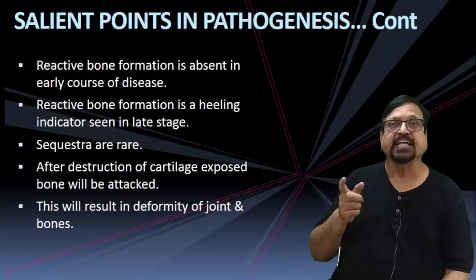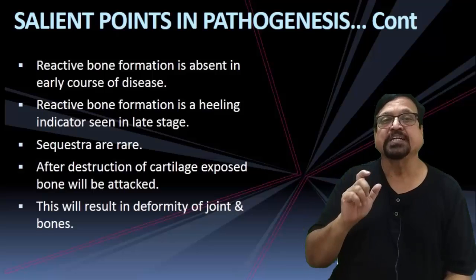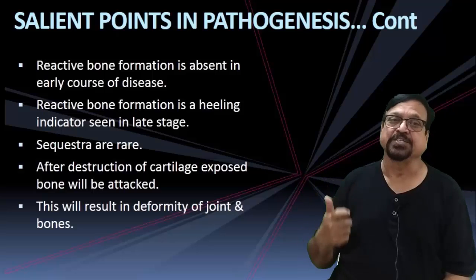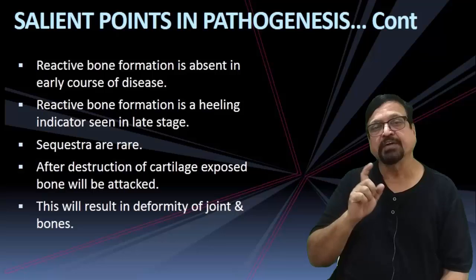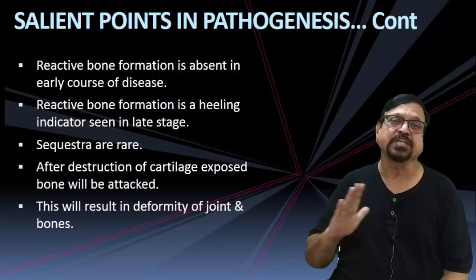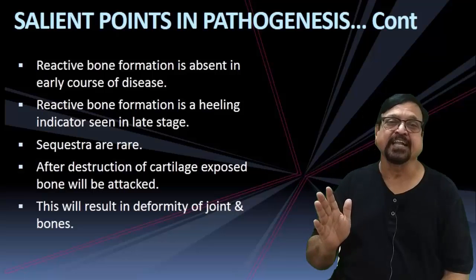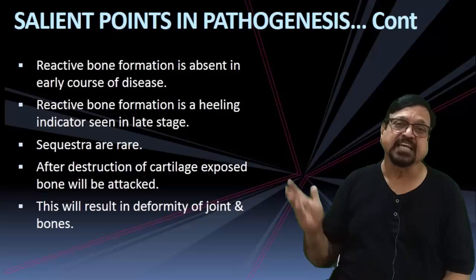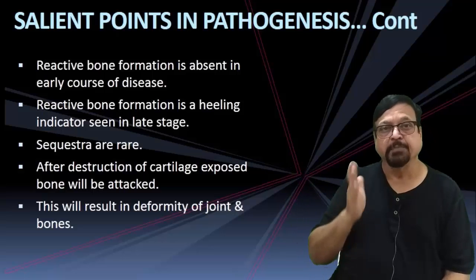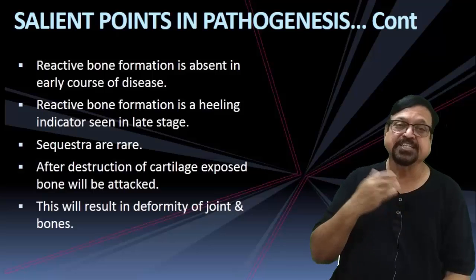Reactive bone formation is a healing indicator. Now, what does it mean to the radiologist? One thing, it is late. So when it is seen, you are very sure that the disease process is going on. It has already eroded the cartilage and disturbed the articular surfaces, and then it has entered the bone. Now, does reactive bone help for detection? Yes.